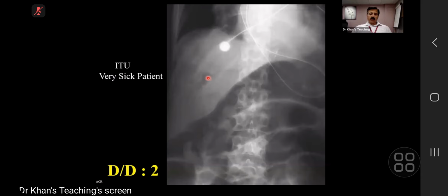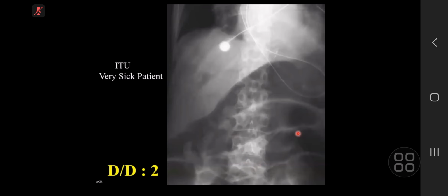So there's a liver shadow, which is obviously obvious, and then there's a gas shadow, whether it's biliary or, I think, not biliary. It's outlining the liver, this shadow. This thing is something which is a point of discussion. But if you see these loops of bowel, they're dilated and gas filled.